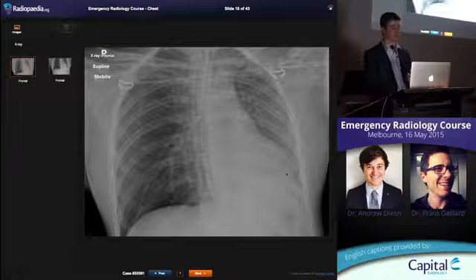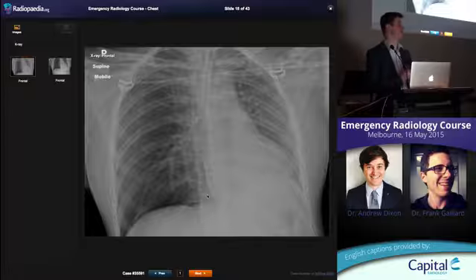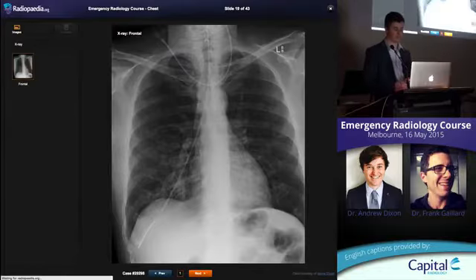You've got the diaphragm coming up, you've got those ribs starting to come together, and you've got the mediastinum starting to move across to the left. So if you see a chest x-ray like this, you know that it's about to completely collapse. The air has to be resorbed, so it does take a little while for it to evolve. So looking for signs of volume loss, volume increase is important to assess hemithorax whiteout.